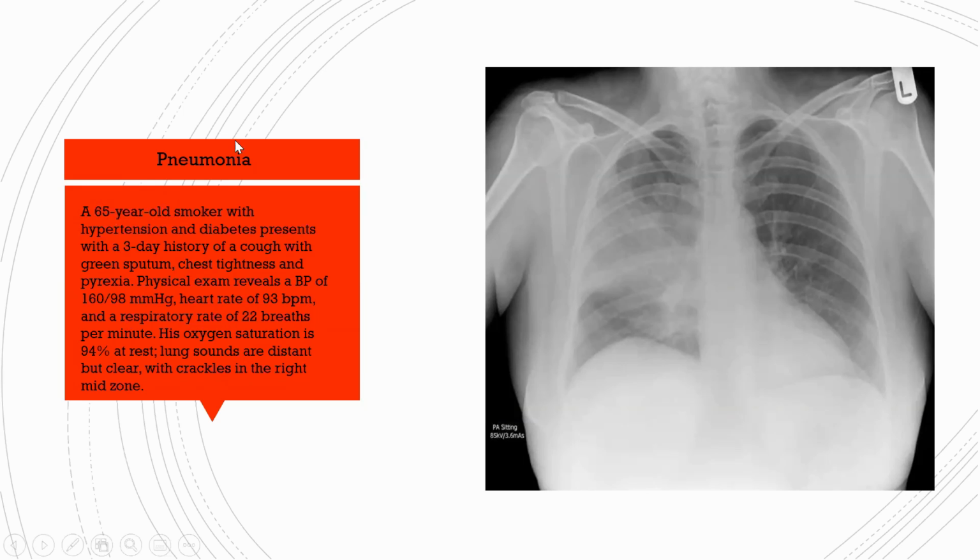True. Yeah, this is a little history. Lung sounds are diminished with crackles in the right middle zone, consistent with what we're seeing here.